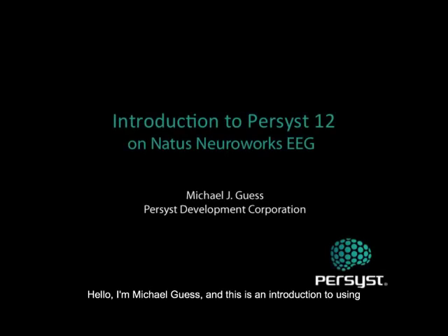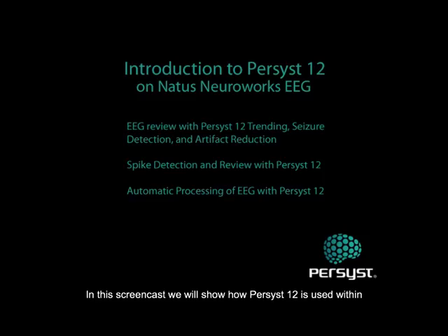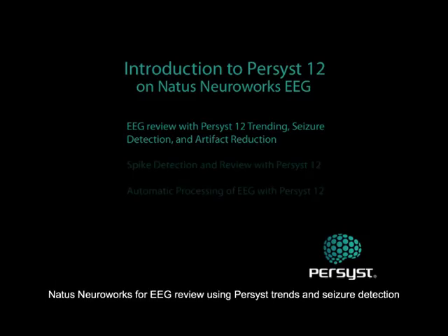Hello, I'm Michael Guess, and this is an introduction to using Persyst 12 as part of a Natus Neuroworks EEG system. In this screencast, we will show how Persyst 12 is used within Natus Neuroworks for EEG review using Persyst trends and seizure detection, and the use of Persyst artifact reduction.